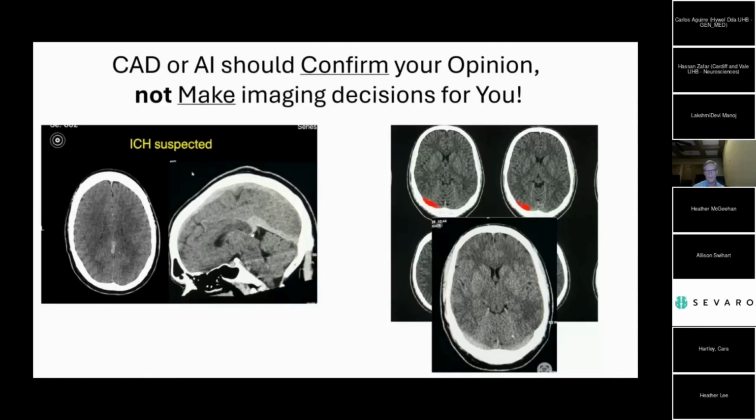That principle also exists when reviewing the CT perfusion studies. They make the summary maps. The summary maps are great. Sometimes the summary maps can be non-diagnostic, but you can still pull information out of the individual perfusion parameter maps. That's going to be a common theme throughout this discussion.